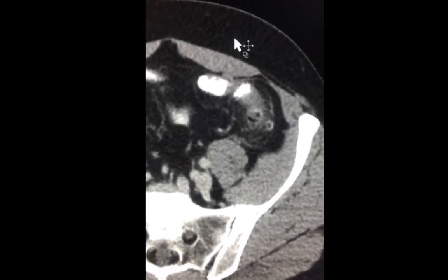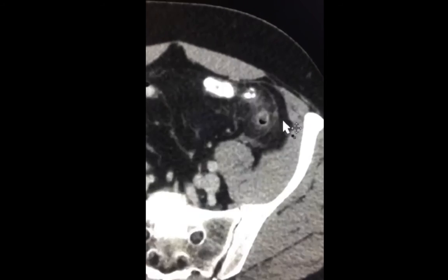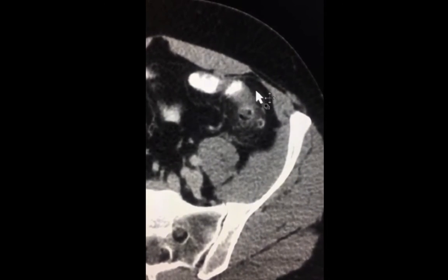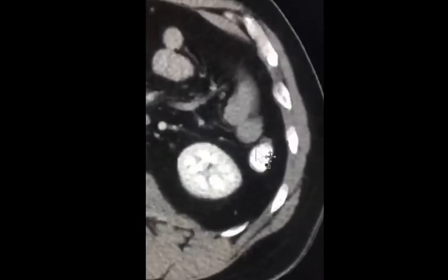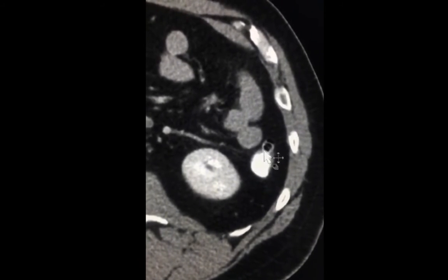Here's another example where the subcutaneous fat is clean, the internal fat is clean, but the fat immediately surrounding the colon in this region is not. As we agreed before, this is called fat stranding, and it's a sign of inflammation, so try to look for a cause. Now, looking at the colon at a different location, you'll notice that you have several areas of outpouching.